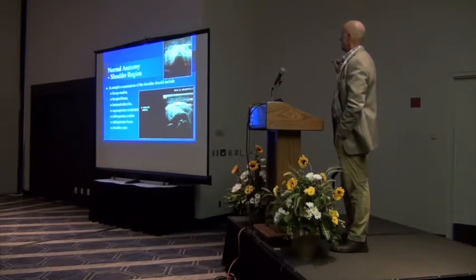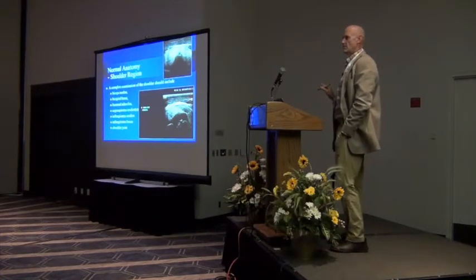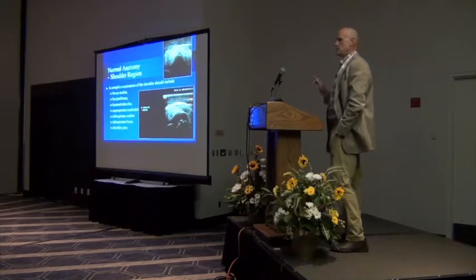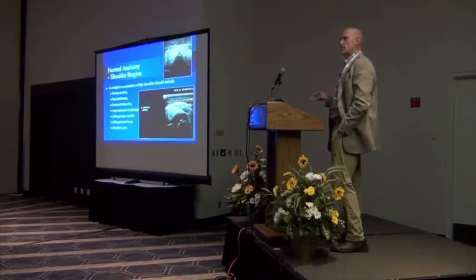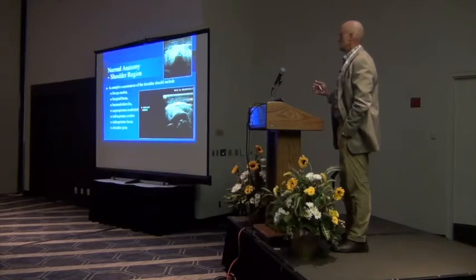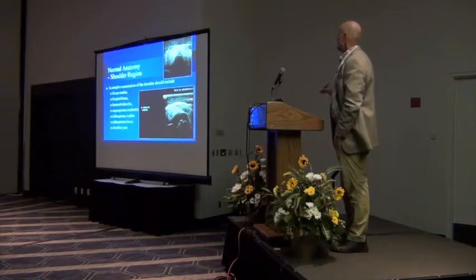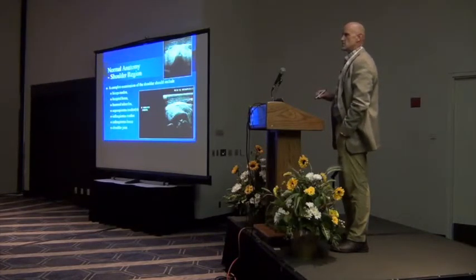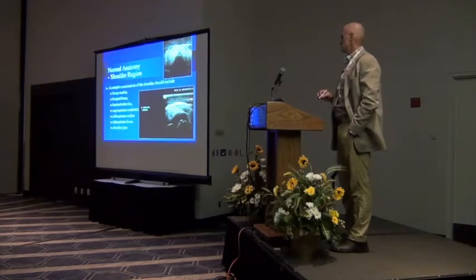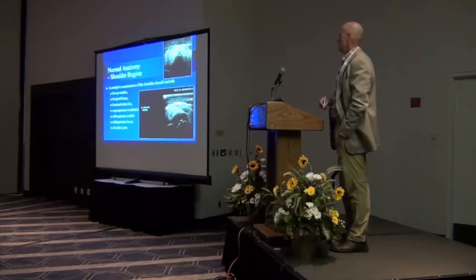This intertubercular area, the intermediate tubercle, is a cartilaginous model in the younger horse, so don't consider that abnormal. And I'm only going to talk briefly about the fact that there is a report of hypoplasia of the tubercles, so that there is actually luxation. Benoit talked about that in some of the, I believe, warm bloods that he sees in France. I don't know that I've seen one in America, but this is not hypoplasia. This is just a cartilage model that hasn't turned to bone. You can see this has now got a wave of ossification that's starting to come up into that area.